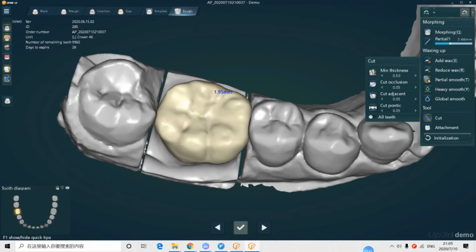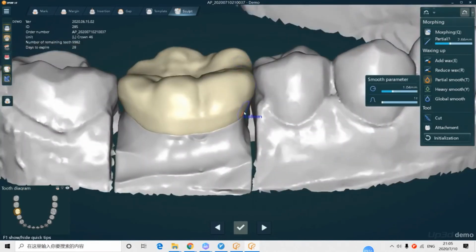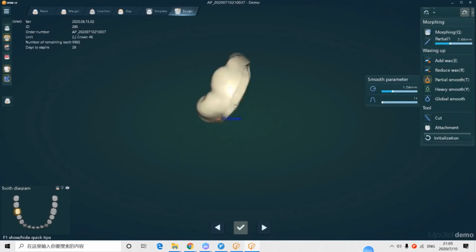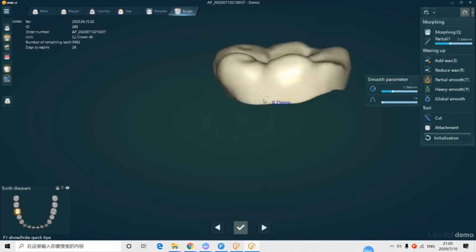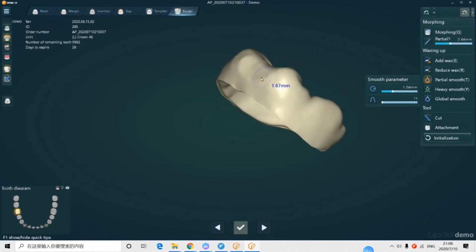Okay, now what we need to do is smooth it. Smooth the bumpy parts. The parts that are pointy, make them smoother or rounder. Especially this part, the collision part. We need to make them really smooth. Make them look good. Okay. This is quite important.